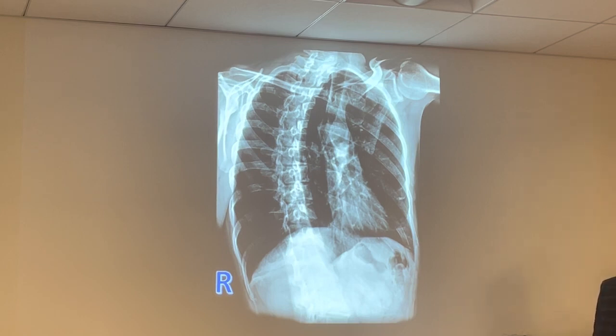So that's a PA oblique. It's a PA oblique. Does that make a little more sense? You don't like it? You gotta know it though. I think this is hard for me. This is an RAO. Because all the PA projections, the opposite one is marked. And all the AP projections, the same side. Correct. The way Monty put it is the way to remember, by the way, guys.